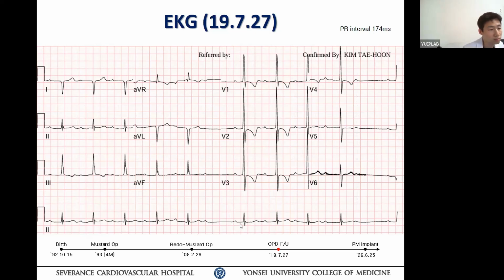But this kind of patient is notorious for structural heart disease, which accompanies high degree AV block. So even though there is progressive PR prolongation and one beat drop, we still need to exclude potential high degree AV block. So I would recommend measuring the RR interval.